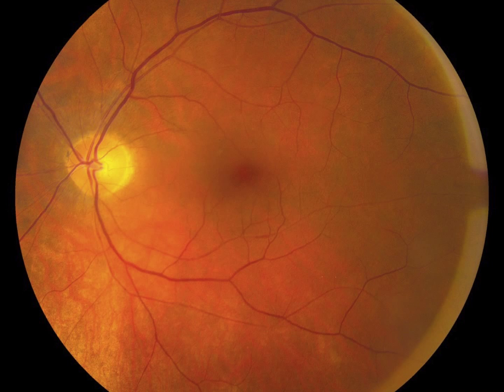CAR and MAR. There's not much to say about this photo, right? You first look at it and you're like, something's a little bit off. But again, color fundus photograph, left eye. Maybe some haziness to the view. I don't know if that's vitritis or maybe a little mild cataract, but just a little bit hazy. Might just be photography, really. You could see some more prominent choroidal vessels. Maybe there's some RPE atrophy. And the most prominent finding, I think, is some vascular attenuation, both veins and arteries, particularly arteries, especially this inferior temporal arcade. And maybe there's some mild pallor, temporal pallor, I'm not sure.